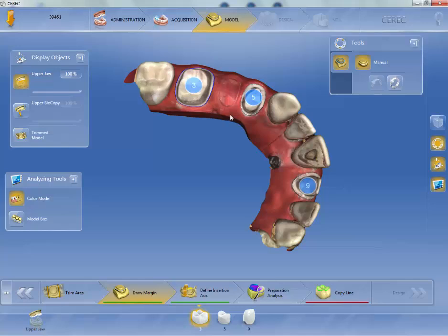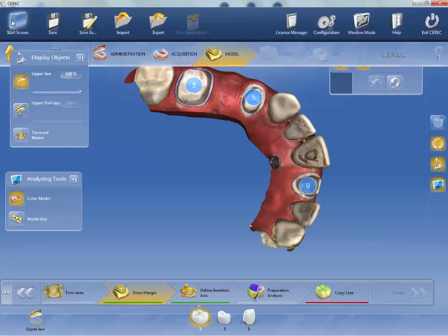Now the other thing I want to show you is anytime you see this light bulb here in the corner. Now it's not highlighted because we haven't gone far enough yet, but anytime that light bulb is highlighted, if I left click on it, the help windows are going to populate and open. We'll show you that in a few minutes. So I'm going to drop down again.